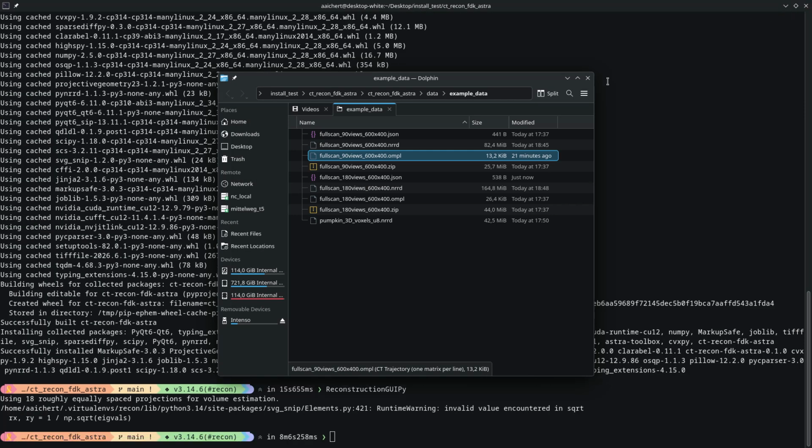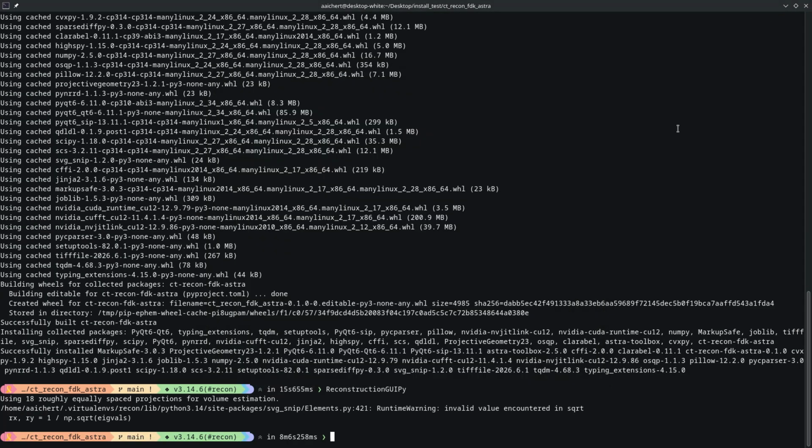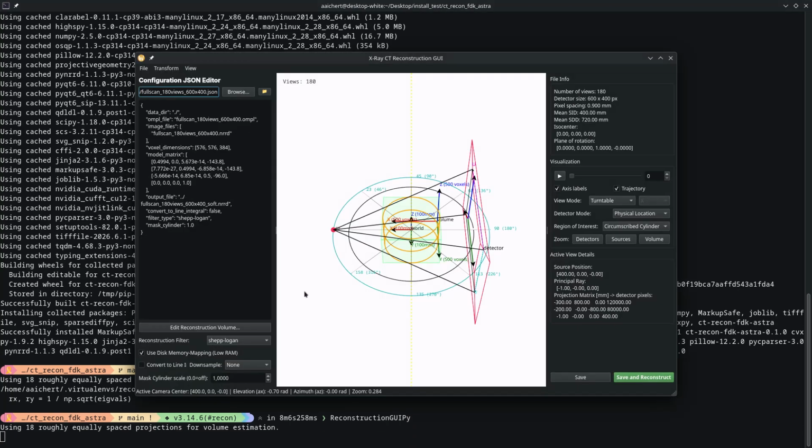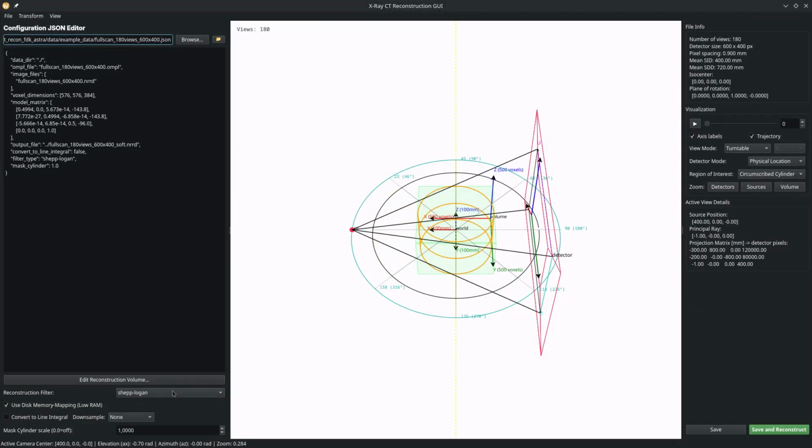But the most important feature of this tool that we'll be using for calibration correction later, if we load the example dataset again, and just for the sake of it, I'm going to do a Ram-Lak, so hard kernel reconstruction as well. Going to change the name of the file, and I'm just going to hit reconstruct again.